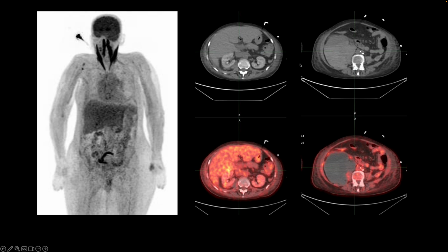On the CT image, we find that the kidneys are holding on to a previously administered intravenous contrast. That's why they are hyperdense, and that tells us that they're not functioning well. And the reason for the kidneys not functioning well is also seen on the scan, which is this collection, which is in the right retroperitoneal space.